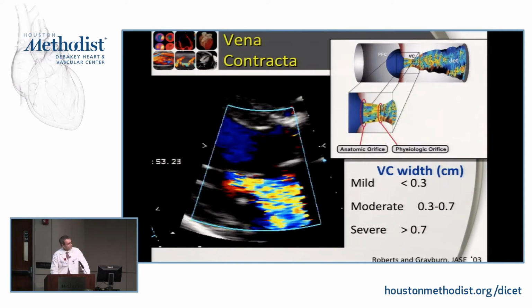Vena contracta, shown here. This is the concept. I like this graphic from... You may want to mention, Steve, where do you measure the diameter for PISA? Okay. Yes. So that's an issue.